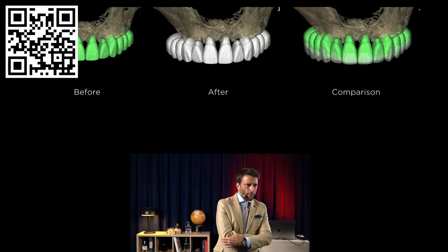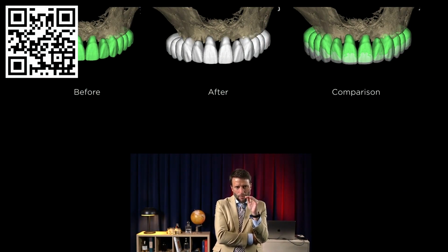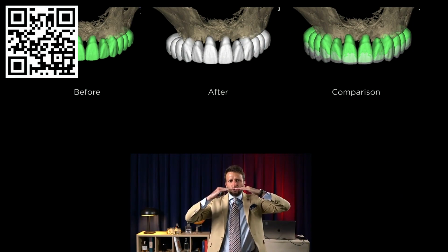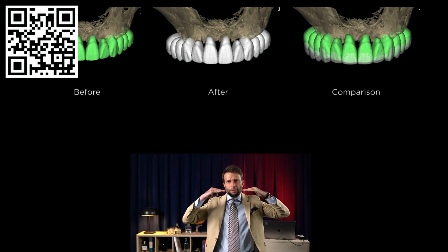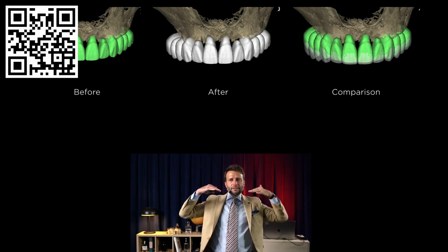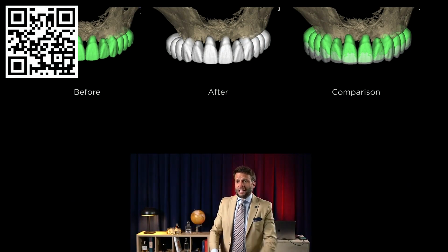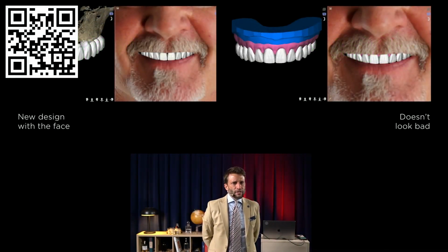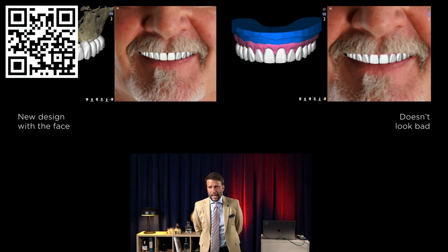So you see here, the before is green, the after is white, and you can see in the comparison how much we are bringing the design down. We are not only bringing the design down, but we are making the smile curve a little bit flatter to bring the posteriors even more down and see if this design is okay with his face. So we go back to his face and it looks okay.